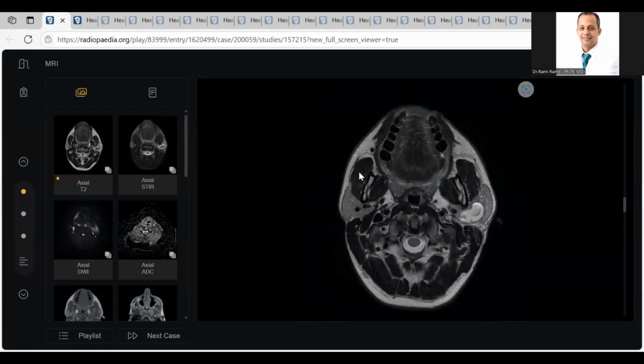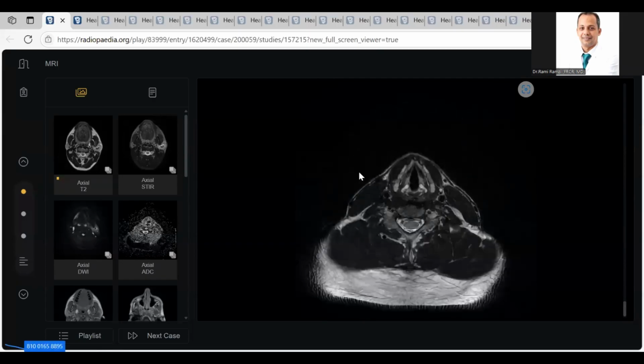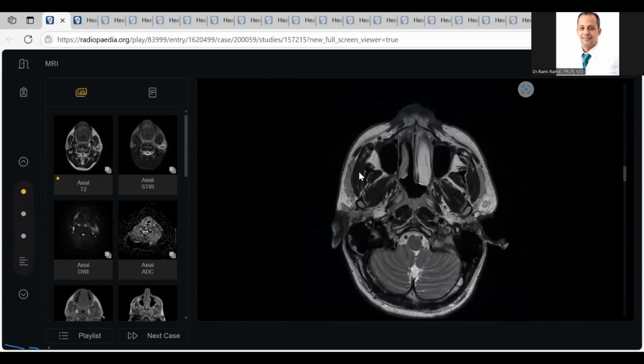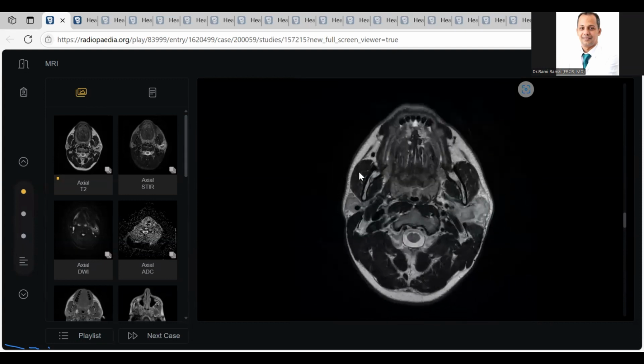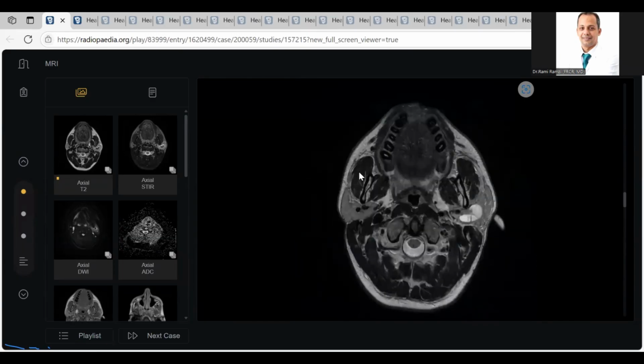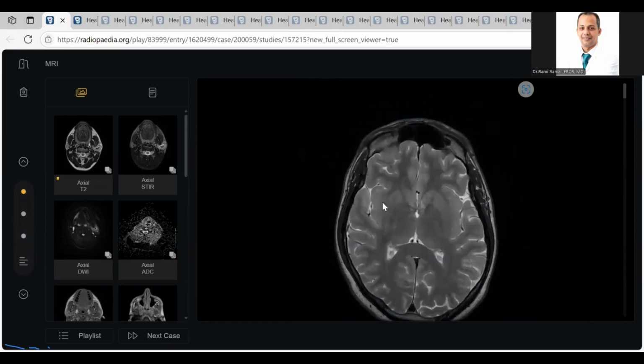But doctor, my advice to you, you start to tell me your findings before you see all the examination. Take your time. Ten seconds is more than enough. Take a look. Okay? Because sometimes the major pathology is not this. It may be a cyst. And there is something here, or there is something in the brain, the major pathology.